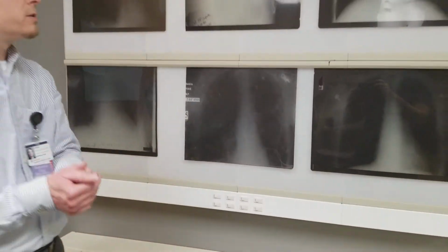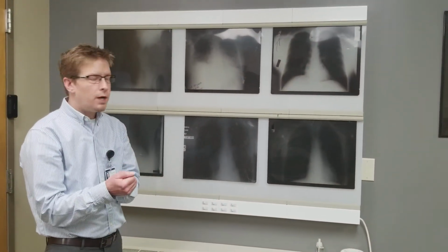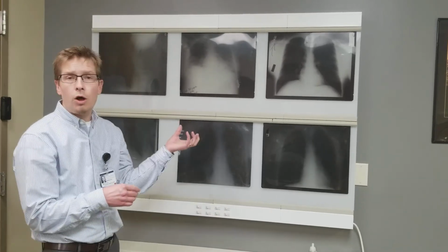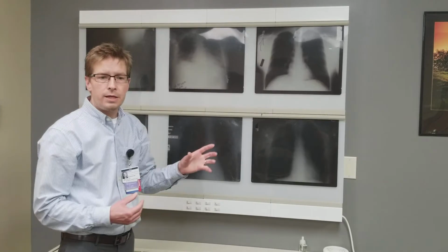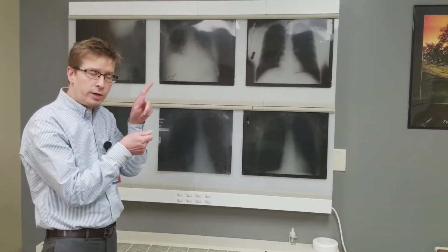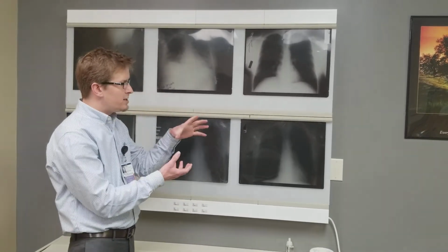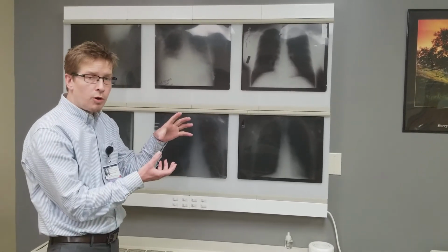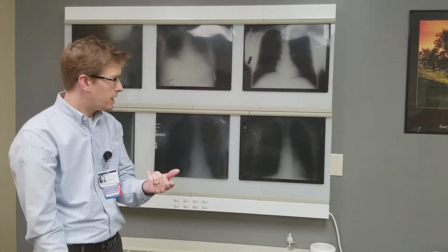So what did we cover? We covered a few techniques. You should be able to determine if your film is good quality, if your patient is rotated. When you see an increased density, if there's air bronchograms or you see little shadows like tree branches, that's a consolidation. If you have an increased density and there's no air bronchograms and that mediastinum is sucking towards it, atelectasis sucks.